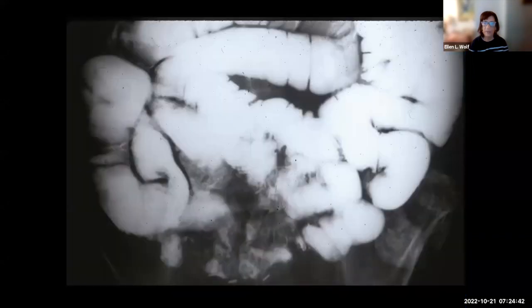This was an example of a patient that had a routine small bowel series. We can see lots of big dilated contrast-filled loops of small bowel, and then again a transition into decompressed small bowel. Now this patient had had previous surgery, as you can see, for a gynecologic malignancy. They had radiation, they had surgery. What is this obstruction due to? Is this due to recurrent tumor? Is this due to adhesions? Is this due to radiation change? Difficult for us to make a specific diagnosis.